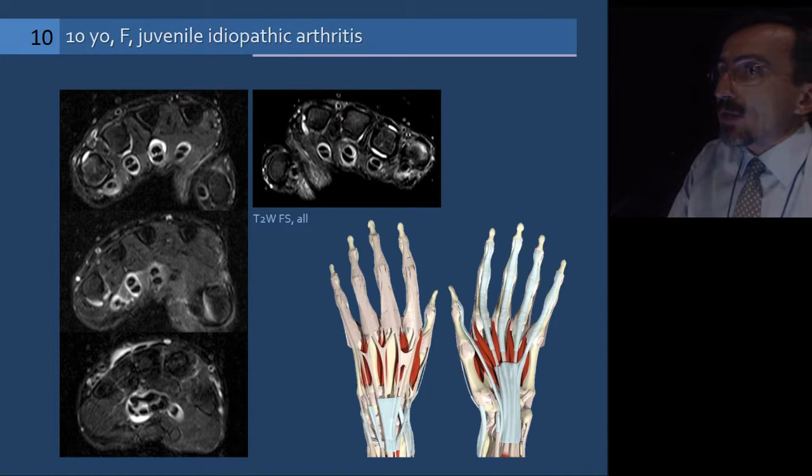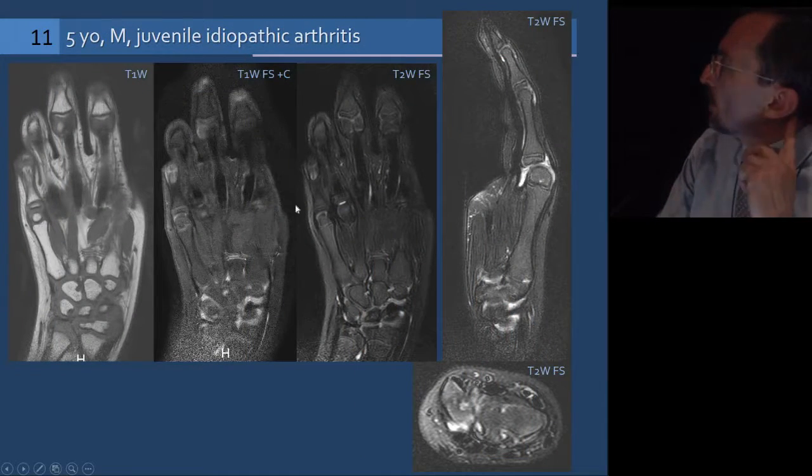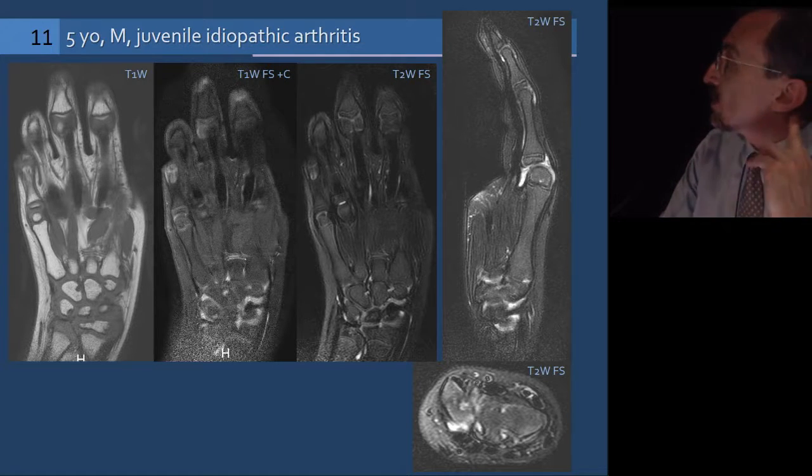So synovitis, the joint synovitis, need not be the part of the picture. Whenever you see scattered or extensive tenosynovitis in the hands, the mention of an inflammatory arthritis like juvenile idiopathic arthritis or rheumatoid arthritis need to be made, because it is not always that you would see the involvement of the joints.